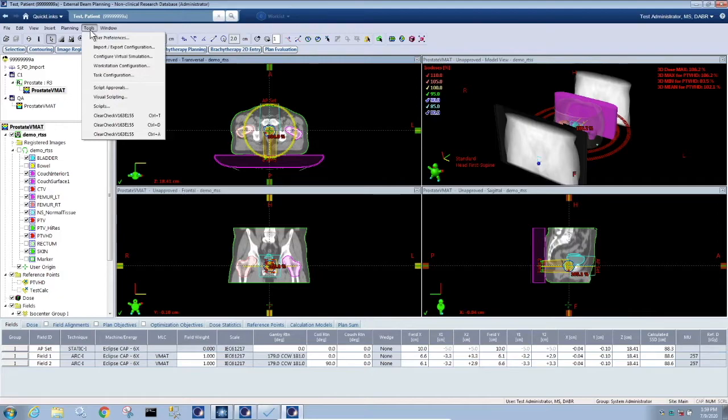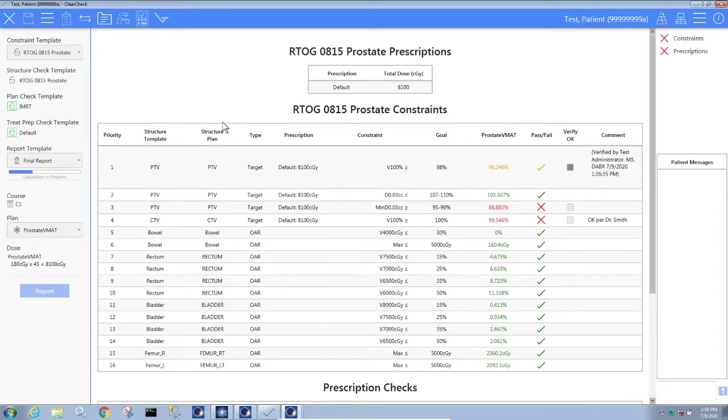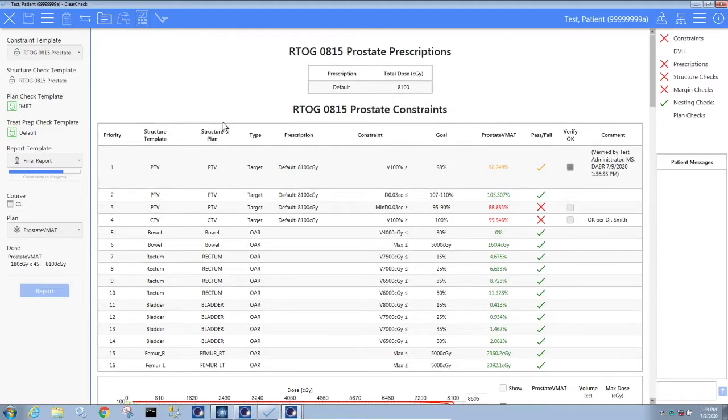So everything is launched from the Tools menu. You can add shortcuts as well, which I've done here. So I'm going to go ahead and hit my shortcut to launch into the script, and we'll let this load up.